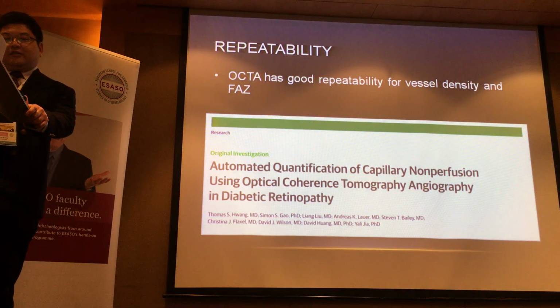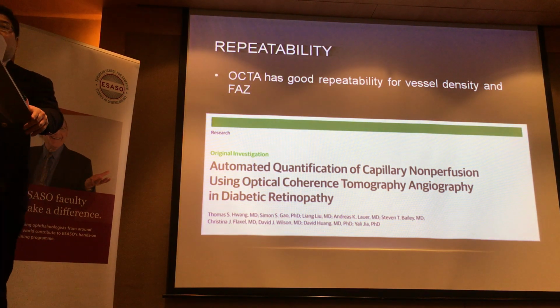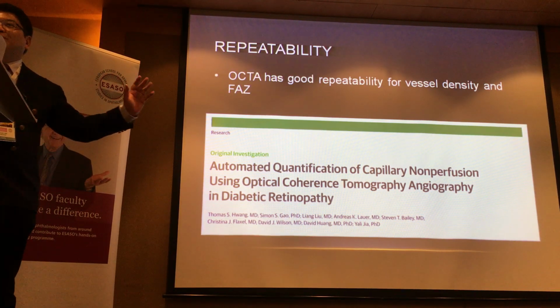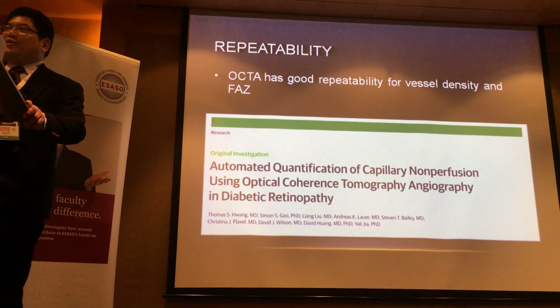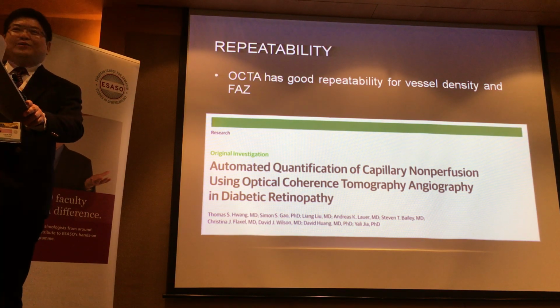Right. But those who have tried repeatability have shown that there's good repeatability for vessel density and FAZ size. Remember though, a lot of it depends on the quality of your image, and Srinivas Sadda and his team have shown that ideally you should take multiple scans and then do a composite of them, and then it gives you even better quality and more reliability, which is great. And I'm sure that may be one way to go, but obviously at this point that's still experimental. So he has a whole army of fellows who will do that for him.